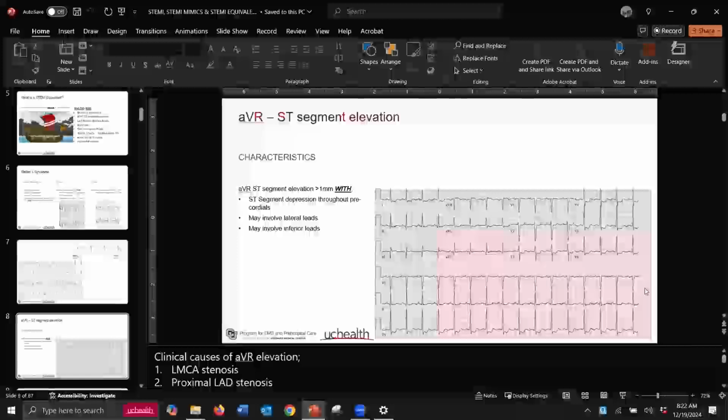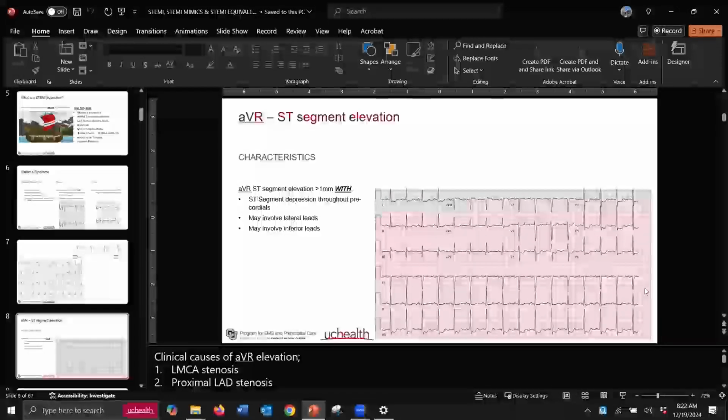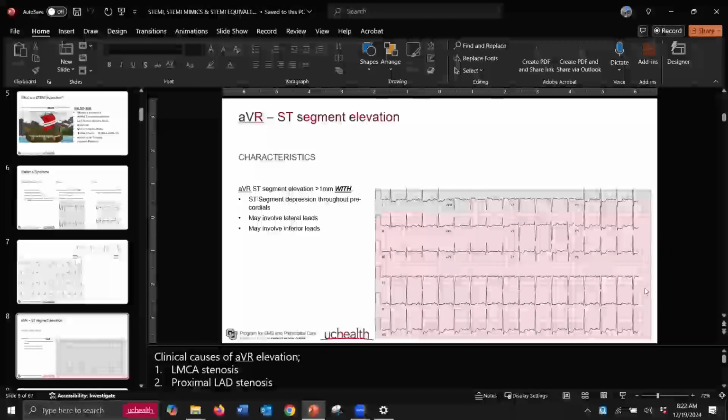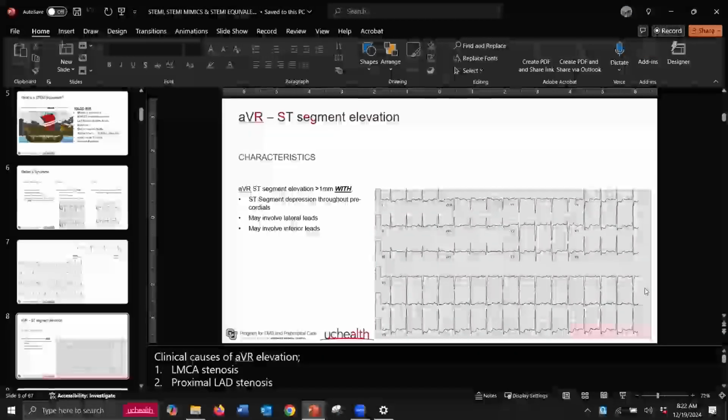I would expect this patient to have normotensive to maybe a little soft blood pressures until they tank. And then it's AMF yo-yo, right? So this is a very bad EKG to me. So how am I going to call this in, right? Because it doesn't meet STEMI alert criteria, does it?